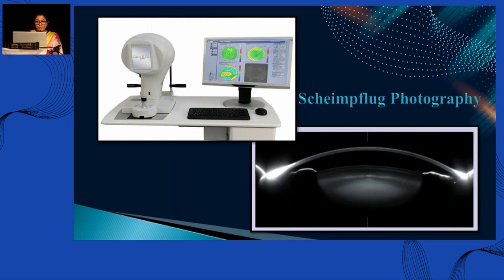Scheimpflug photography, as in the Pentacam, uses a rotating Scheimpflug camera to provide a three-dimensional image of the anterior segment. Although this non-contact device allows rapid image acquisition and provides measurements of anterior chamber depth and volume, corneal thickness and lens thickness, it does not provide detailed information about the angle recess due to light scattering. Therefore, it has limited application in documenting angle closure.